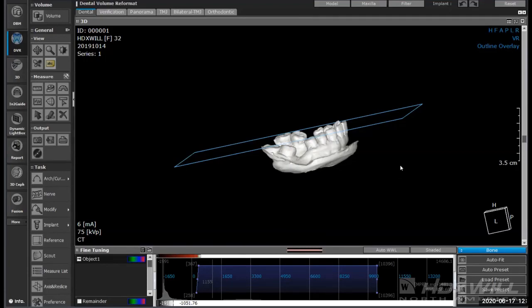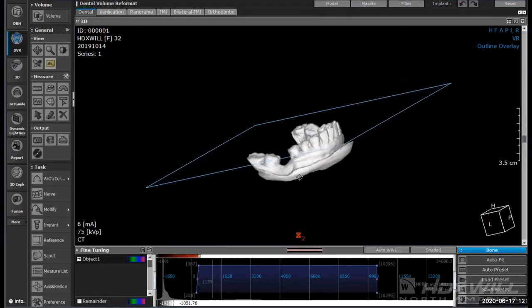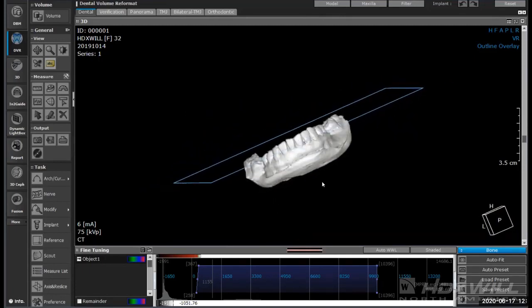So this is what a scan of a stone model would look like. In this case, we have the soft tissue interaction around those teeth, so you can interact that with the CBCT you already have in play. There are a lot of different ways we can make this into an STL and then superimpose it over, so it gives us a lot of different directions we can go.